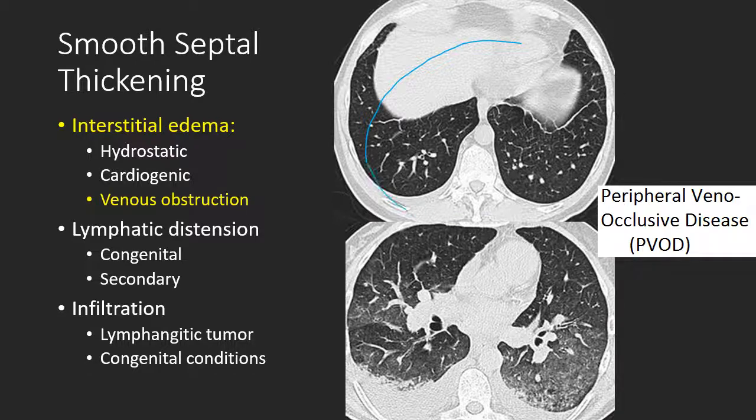We have someone that's relatively normal on the CT on top. They were then placed on a pulmonary arterial dilator and developed pulmonary edema. On CT, this is manifesting as areas of ground glass opacity, as well as pleural effusions. So it's an example of PVOD with decompensation following pulmonary arterial dilation. Okay, this is a common clinical scenario. That's a really good clue that you're looking at PVOD.